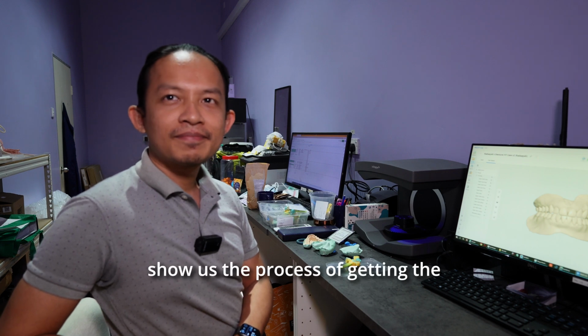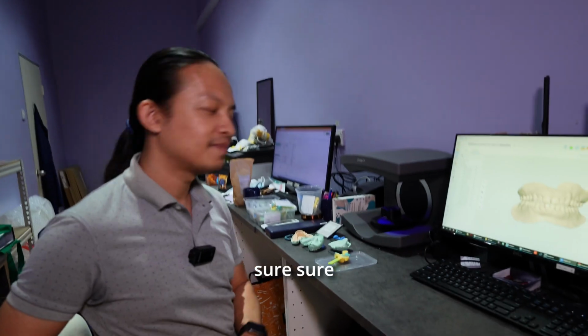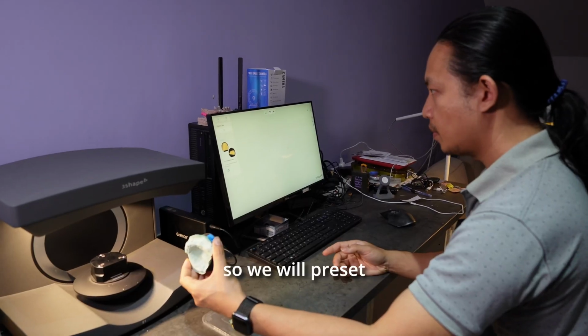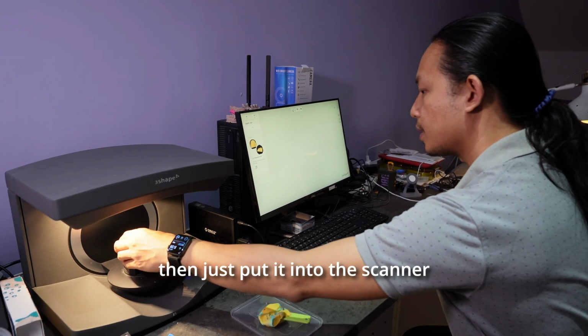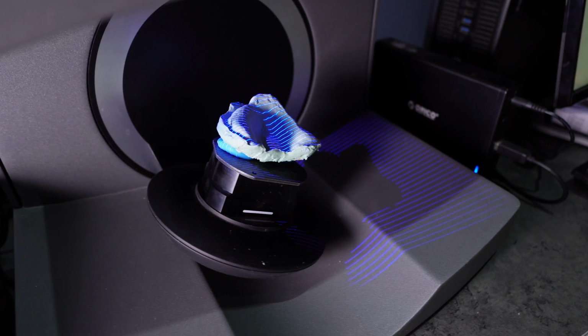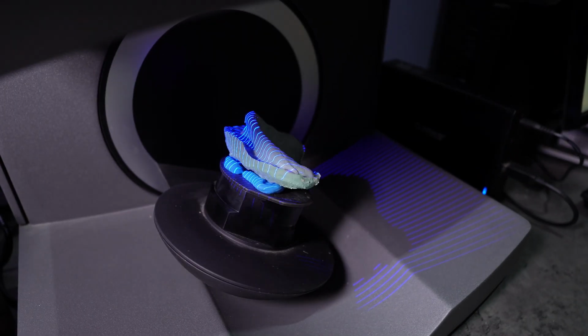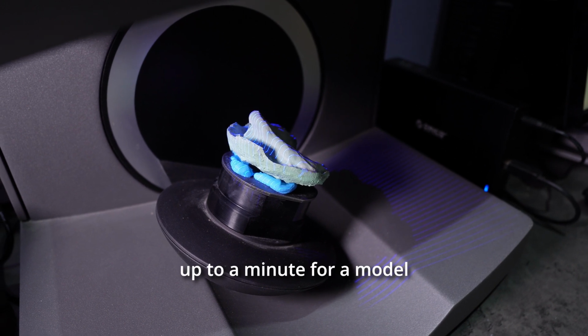Right. Can you show us the process of getting the desktop scanner to run? Sure. So we preset what we want to scan, then just put the order into the scanner, then we start to scan. How long usually does this process take? Usually it will take a few seconds, up to a minute for a model.